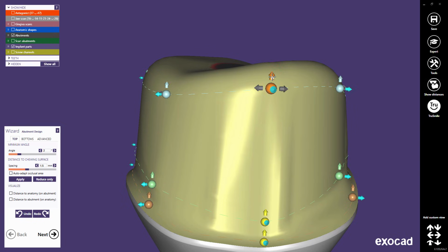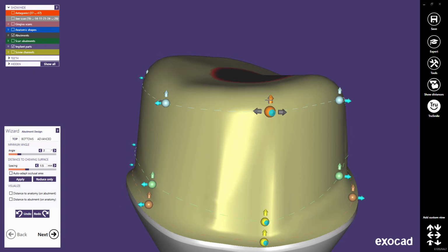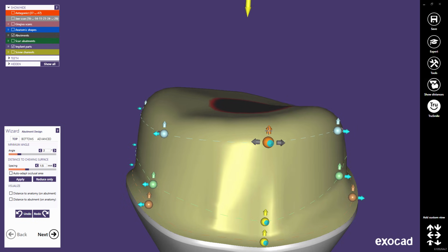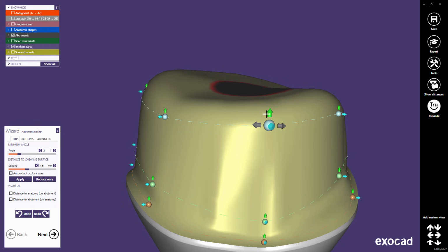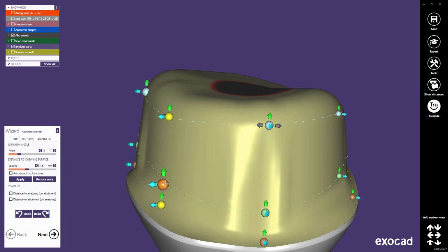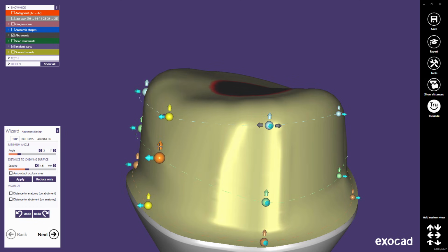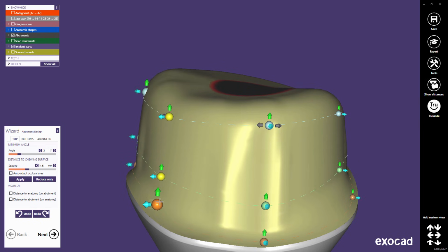Use Shift and the left mouse button to drag 3 control points in a row, and Control and the left mouse button to drag all control points on a curve. Note that the software avoids undercuts and enforces production-specific design restrictions. Therefore, there is, intentionally, some restriction in movement. And moving one control point can move also another control point above or below.